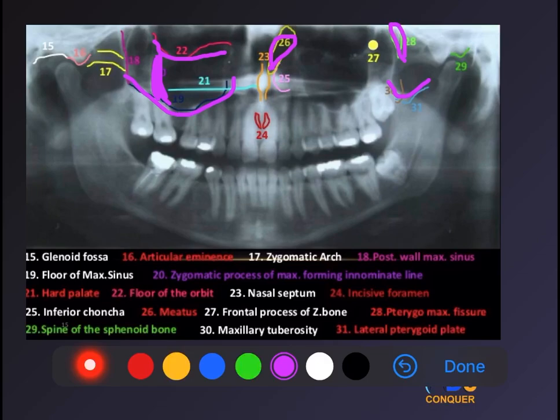So there is nothing to memorize by heart in this. You have to look at the image and get a crystal clear idea of the anatomical landmarks through the image itself. So you should capture the image with your eyes and then remember. And if you see a lot of OPGs, then you have to try to identify the landmarks which are actually difficult. See, the mandible, the maxilla, the maxillary sinus and all are actually easy to identify, right? Which are difficult, you need to identify and locate on an OPG image which is given to you. So like that you can make a practice of it.